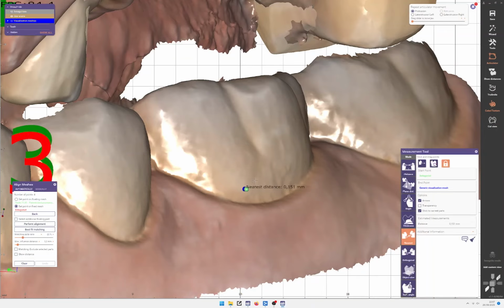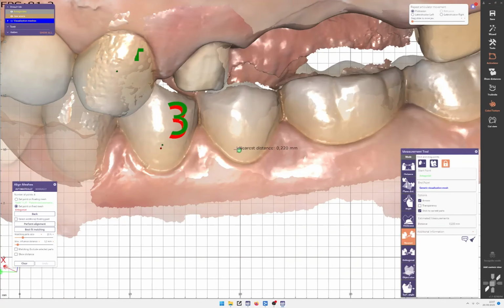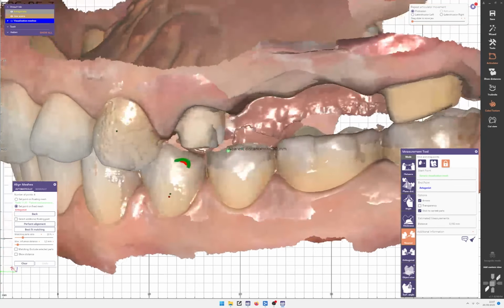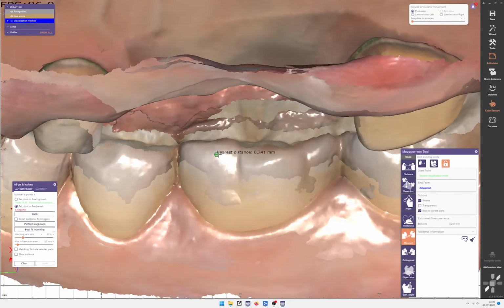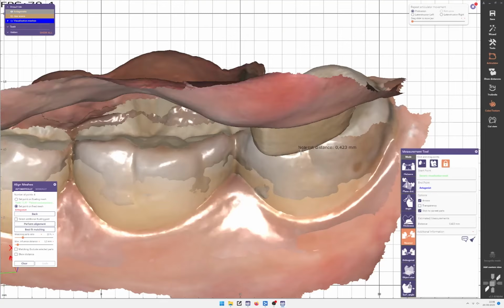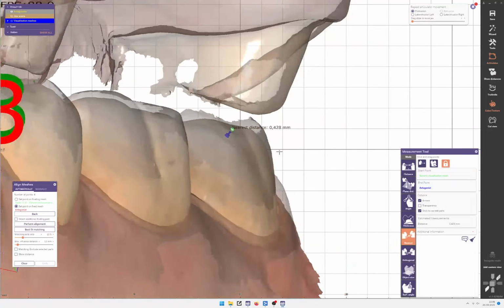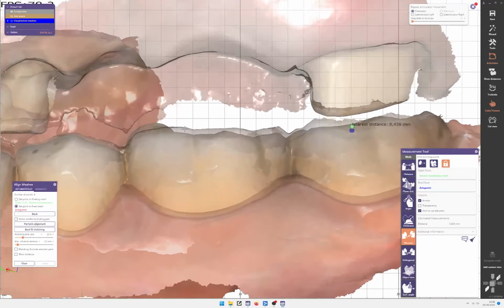It's like 150 microns here on the equators, 200 here, but the important part are up here, the cusps. We start going into 200 microns, 250 microns, 370 microns, and all the way back here, we're now at almost half a millimeter. We're at 400 microns. That's huge. And look at the deviation. It's huge. You can see, yeah, this is a good angle. So you see how much it deviates.